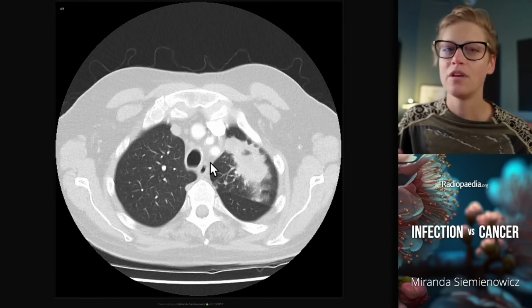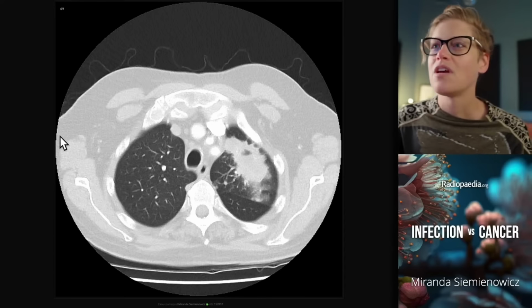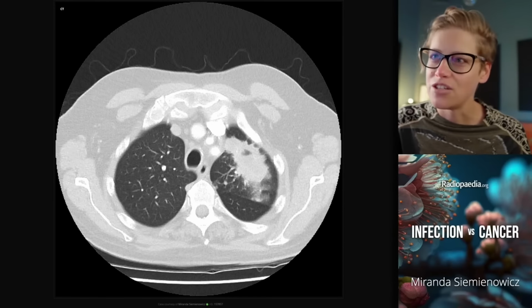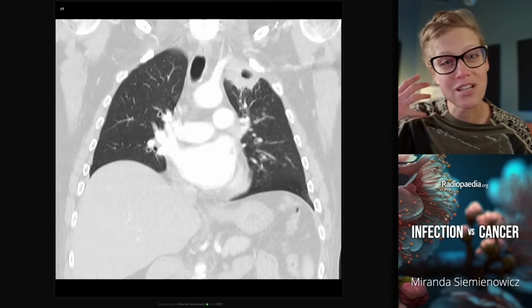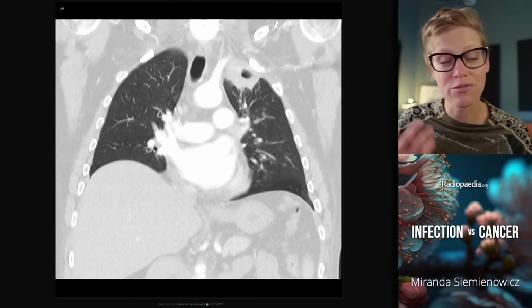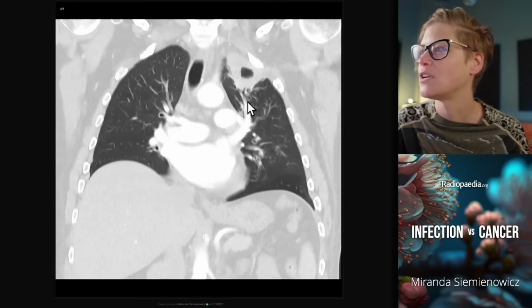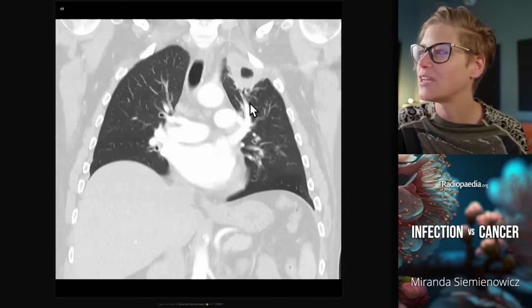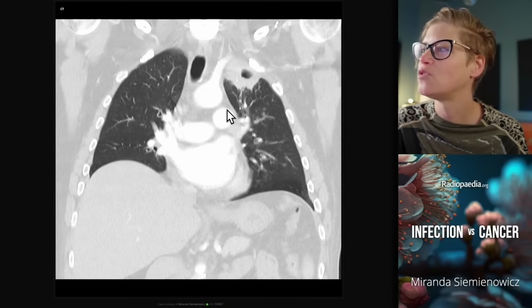Now, you would never look at a fracture in just one projection. And so you would never look at a lung lesion in just one plane, because the lung is a three-dimensional organ. Lung lesions are complex in their geometry in 3 dimensions, and we always review everything on at least 2 different planes. And when I scroll through this lesion on the coronal image, I can again see those beautiful polygonal margins with straight lines, with 120-degree angles, with this polygonal morphology here.